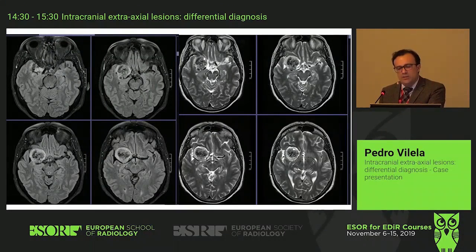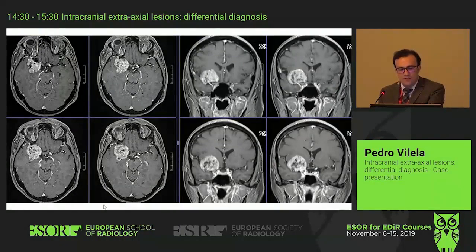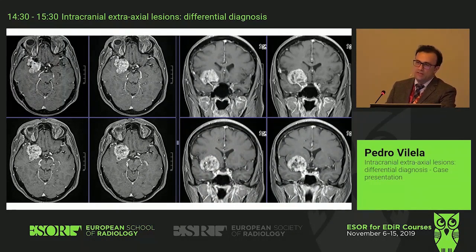I have seen this image when we were doing the lecture. As an example, you see the complete CSF cleft around it. So what is happening with this meningioma? What is happening here inside this? What? Calcium, right? Because it has low signal, and maybe you will also have some vessels. Okay, you give contrast, what do you see? I see intense contrast enhancement. Well, it's a bit heterogeneous, probably due to the calcifications. Very good. So the solid non-calcified component will enhance, the calcium components will not enhance.